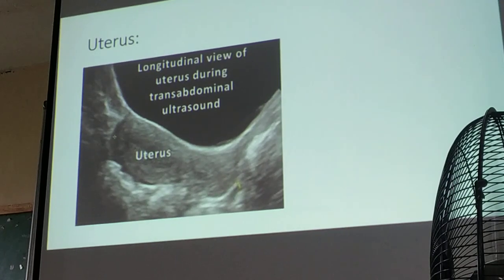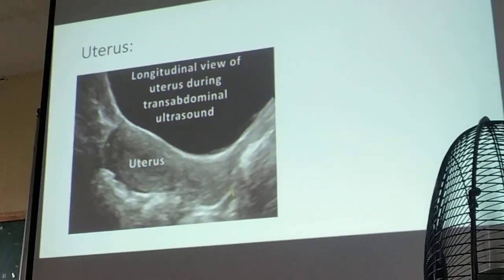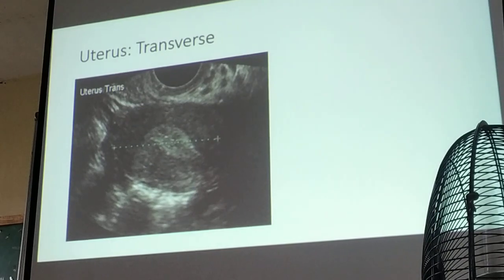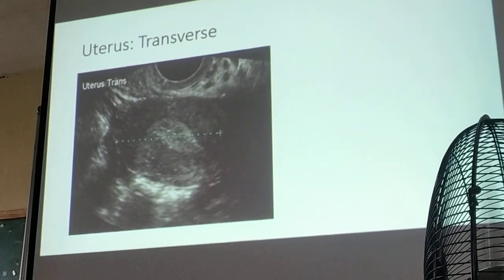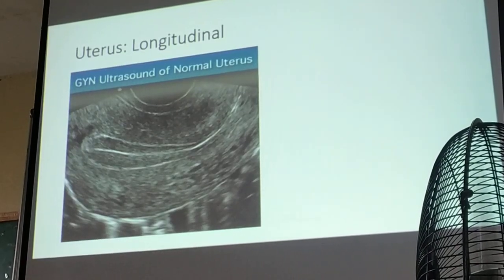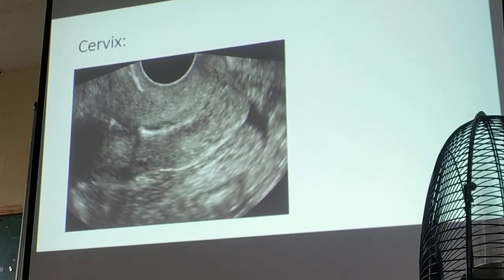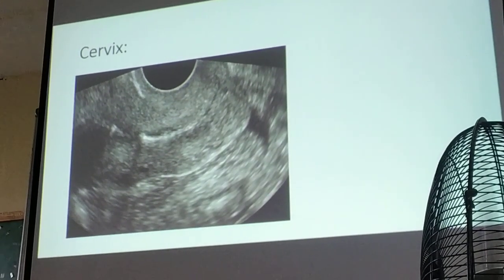Okay, this is the normal uterus using your curvilinear probe. Okay? Convex. And then this is the transverse diameter. There's no need for you to study this, okay? These two slides are very important, okay? But not this. This one is the cervix. There's no need. I might be showing you the nabothian cysts at the cervix, but those are not really that important, okay?